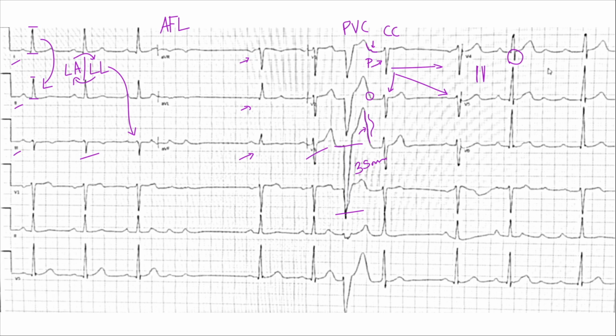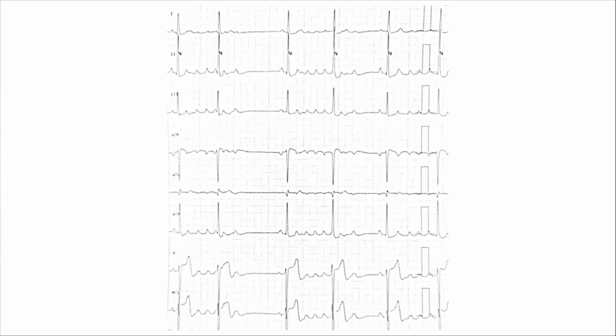Now let's take a look at what happened a couple hours later. Okay, so when I say a couple, I really have no idea. This was handed to me with very, very little information, and so I'm just kind of working through this. But watch this. So this is a couple hours later. Let's say it's 2 hours later.